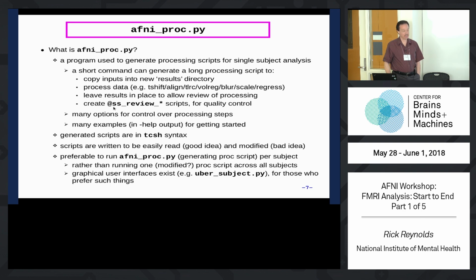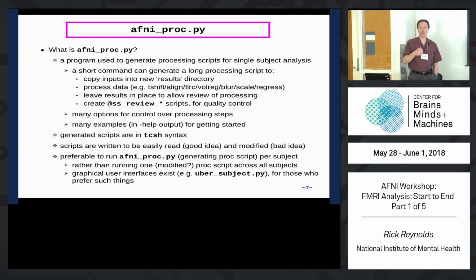It also generates some quality control scripts that you can run. It generates one called @ssReviewDriver, which you run and it will walk you through some basic quality control for that subject. And you should do that for every subject. That script is like the minimum quality control. We'll get to that.